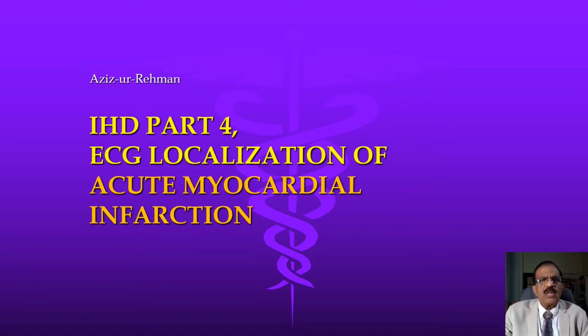Now, of course, the most important thing is to be able to make the diagnosis of acute myocardial infarction, but it is perhaps also important to be able to localize the exact area of infarction. It could be anterior wall or posterior wall or lateral wall or inferior wall. And I think ECG is a great tool to help us make that diagnosis.